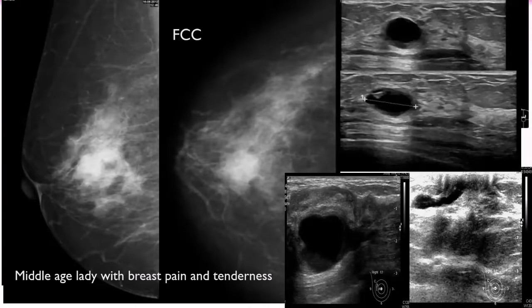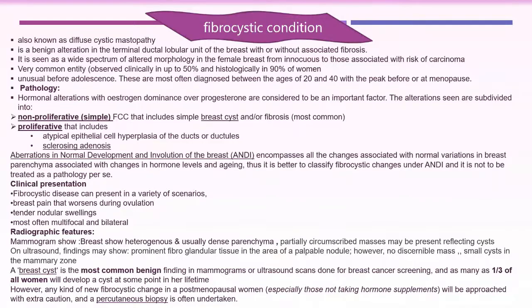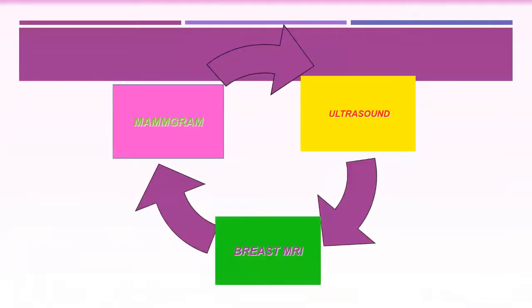because it was an inflammatory cyst in the case of a fibrocystic process, fibrocystic conditions. So we said indistinct lesions sometimes can be just an inflammatory cyst, and in this case it had multiple complicated cysts. This is one of the cysts, and ductectasia. But it was not just simple fibrocystic. So fibrocystic can be simple or proliferative. We'll talk about it later because of the time. Now we cannot dig into pathology.